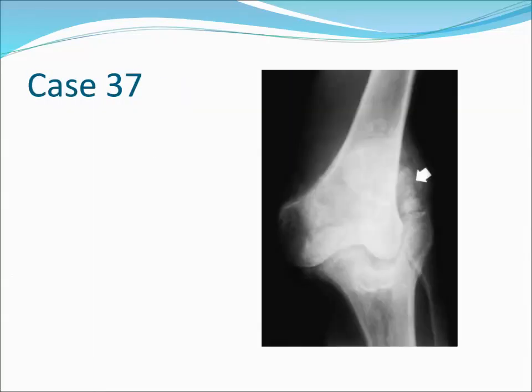An AP view of the knee in this patient with tabes dorsalis shows the classic changes of a neuropathic or Charcot's joint. Note the severe joint destruction, the subluxation, and the heterotopic new bone (arrow). Please remember the 6 Ds of Charcot joint: density change, subchondral osteopenia or sclerosis; destruction, osseous fragmentation and resorption; debris, intra-articular loose bodies; distension, joint effusion; disorganization and dislocation, joint malalignment due to ligamentous laxity.